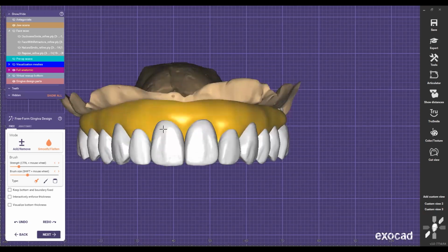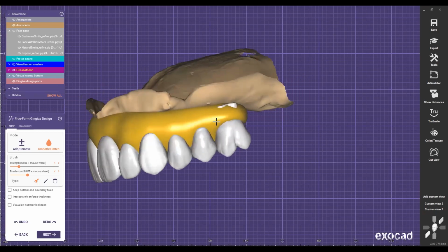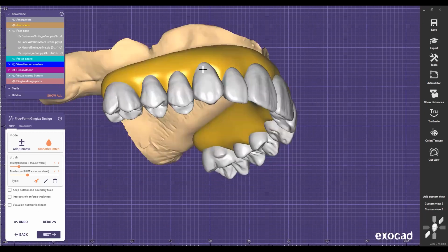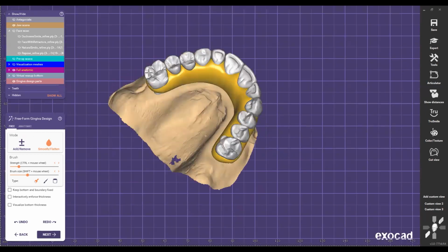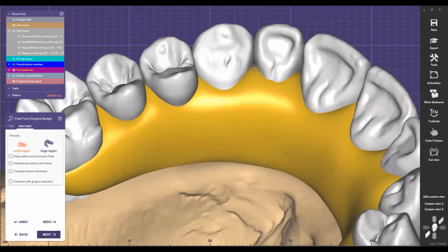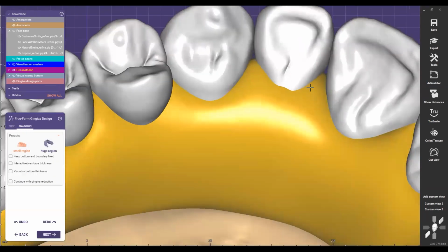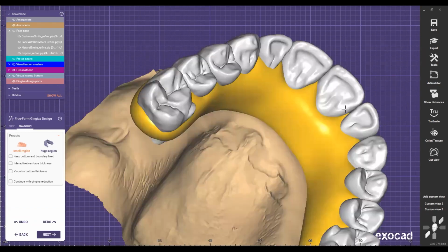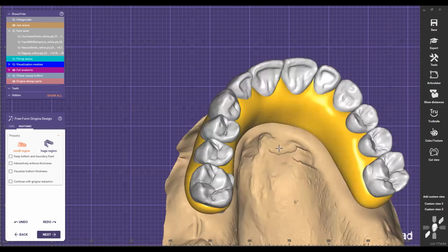So from here, I'm gonna leave it there because the neck is right there, but later I'm just gonna start pulling those areas so that I can get a nice ideal position of this. So now I'm gonna go ahead and just pull these areas a little bit higher so that the connector here will become better. Here, here. So I go here, I go here.